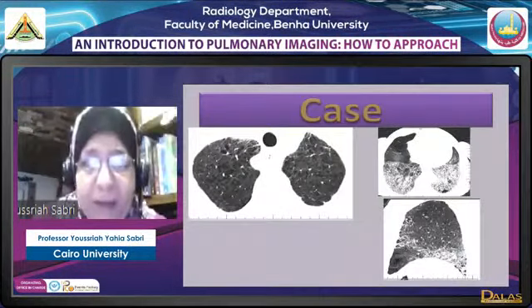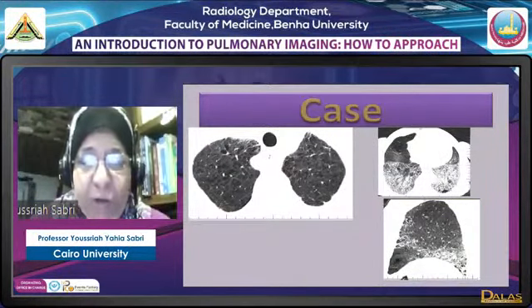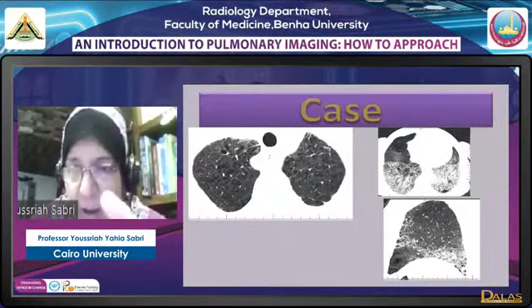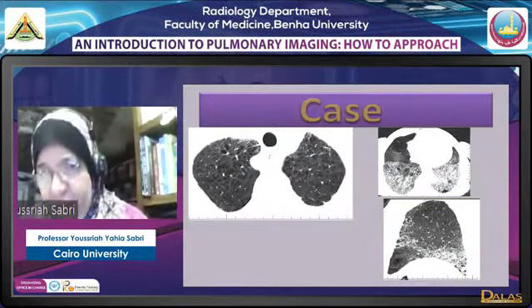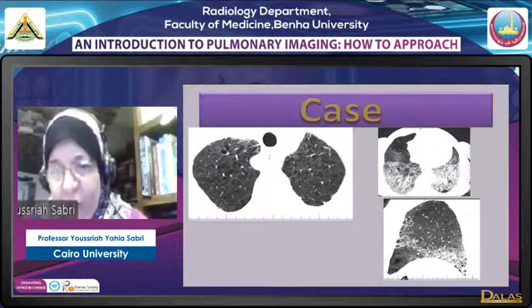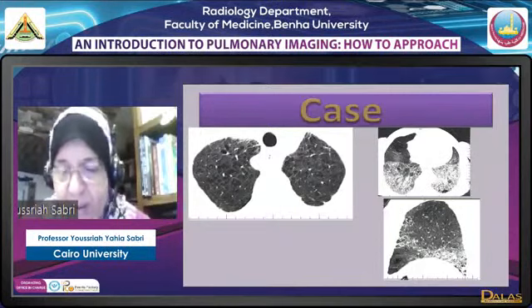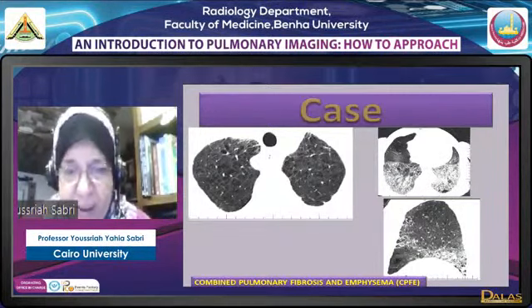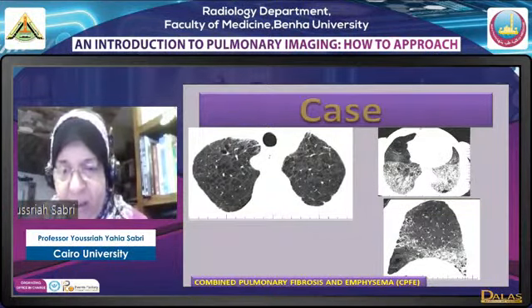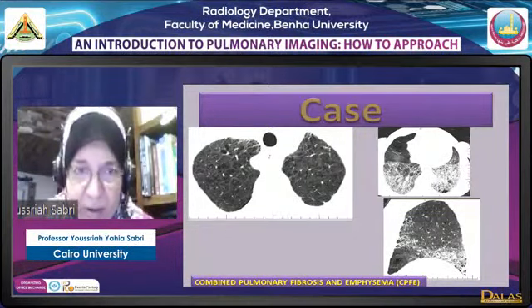Now I find associated lesions. In this case, for example, in the heavy smoker, we have the central lobular emphysema. Central lobular emphysema is a smoking-related emphysema. While basally, we have bilateral, fairly symmetrical, subpleural, or actually predominant lower lobe affection, with pleural recess affection, decreased volume of the lower lobe, and traction bronchiectasis and bronchiolectasis. We have interstitial fibrosis. This actually forms a disease entity which is not uncommon nowadays, called combined pulmonary fibrosis and emphysema, CPFE, and it's a smoking-related disease.